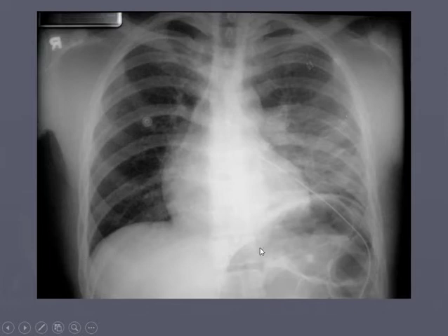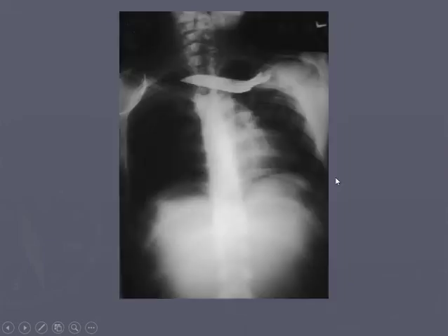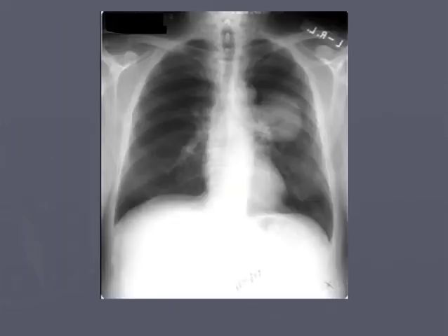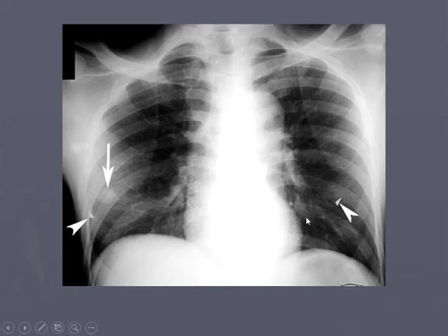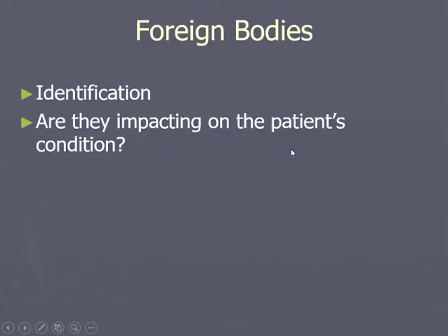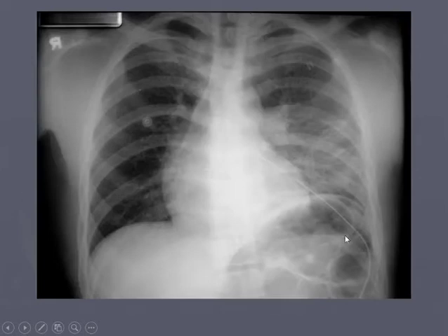Left side, uh-oh. What's this? Let's look at these other diaphragm pictures just to get an idea what I'm talking about here. When we see our diaphragms, we can usually see an air bubble, but it's not overly bubbly. And then look over here.